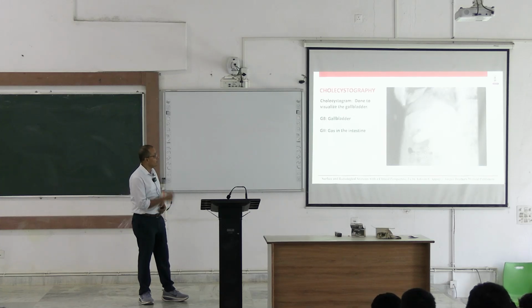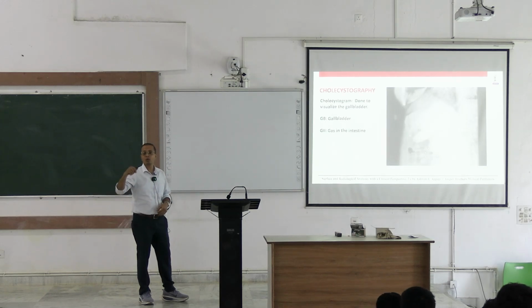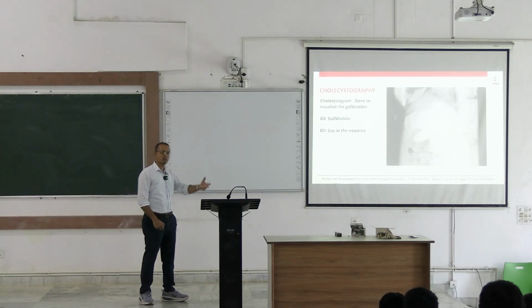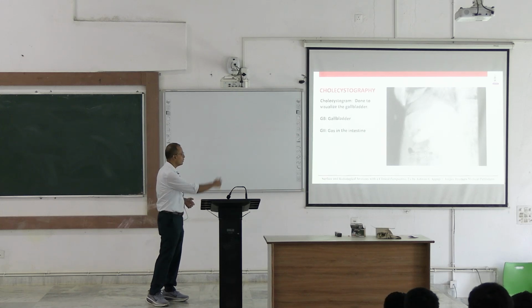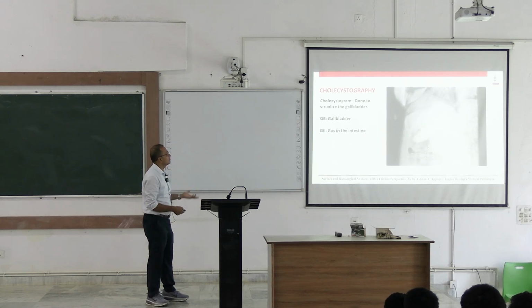So if you have a filling defect in the gallbladder, that means the interior of the gallbladder is not visualized properly. You have to investigate more to exclude whether it is a tumor or a stone. So this is the kind of picture we see here.